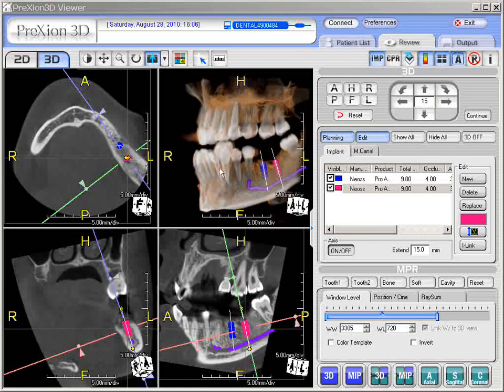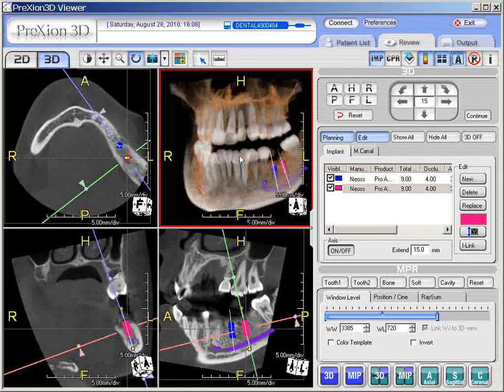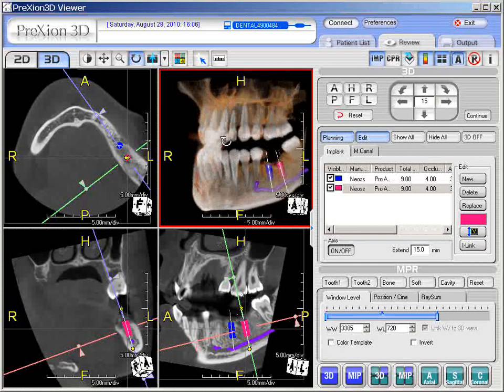And once it's loaded up, you're back to where you saved the scene originally, and you can rotate and you can continue on if you wanted to go to the other side or just whatever you wish to do. It's like you're starting a brand new study, but you're just recalling it from the portion where you saved. So you definitely want to save your work.